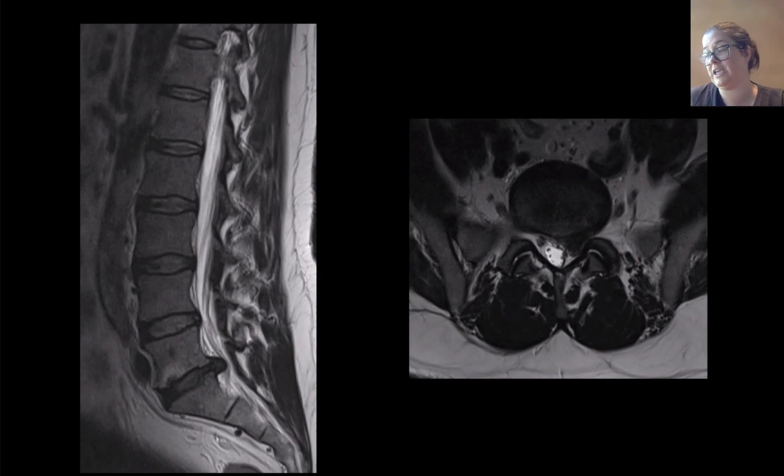Maybe I can dig into it a bit more. If I go from the nomenclature paper, if I'm looking at the parent disc, definitely the contact is narrower than the rest of the disc, so extrusion. But I do not disagree, Derek. I have seen other papers where they would say, well, it's actually the base of the disc rather than the contact with the disc space, so this must actually be a protrusion.